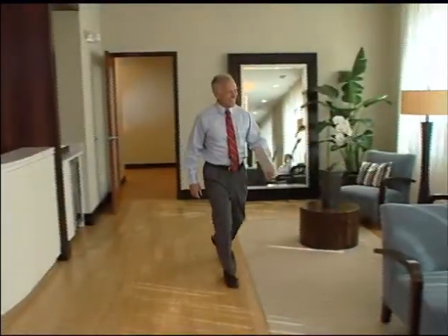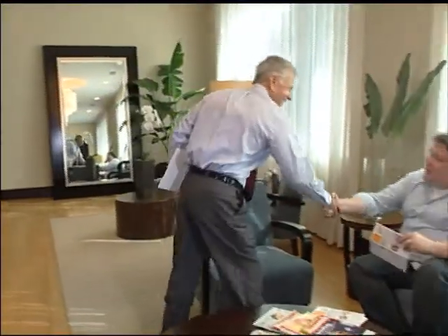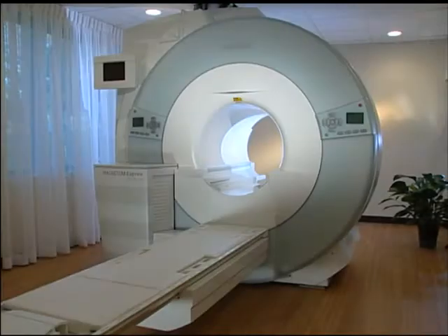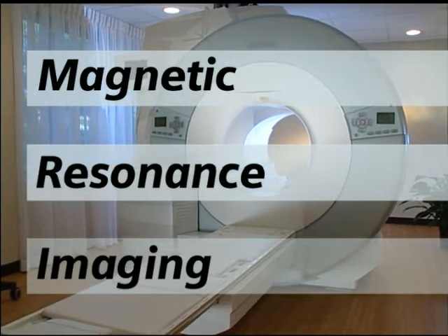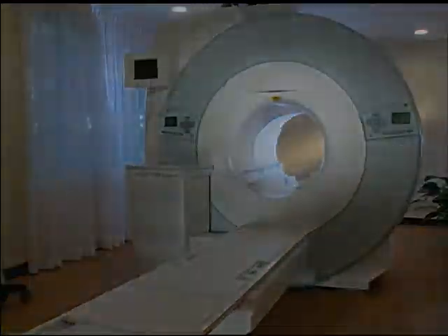Welcome to this MRI patient education videotape. Your physician has ordered an MRI medical examination. What is MRI? MRI stands for magnetic resonance imaging, and for the next few minutes, we'll discuss the MRI examination.